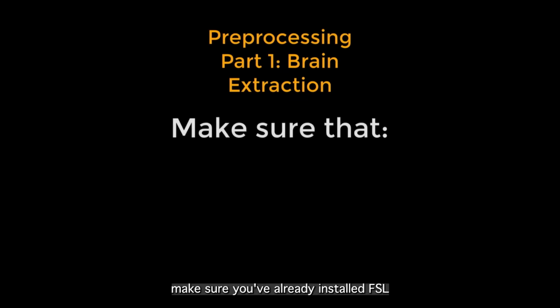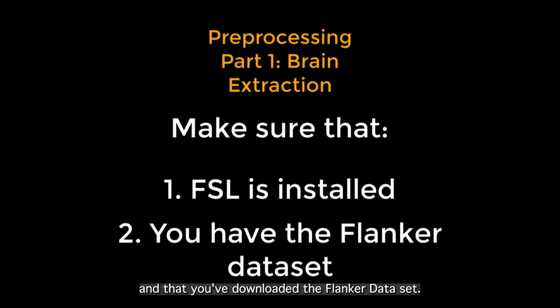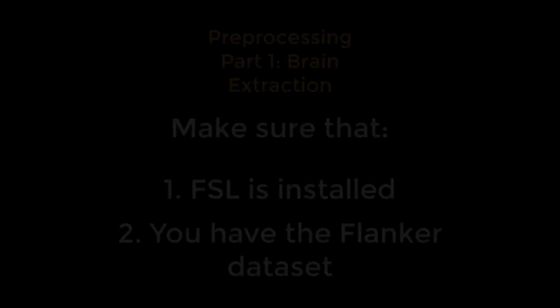This video will show you how to do all of the pre-processing steps on your computer. Before you continue, make sure you've already installed FSL and that you've downloaded the Flanker dataset. If you need help with either of those, see the links in the More info box down below.